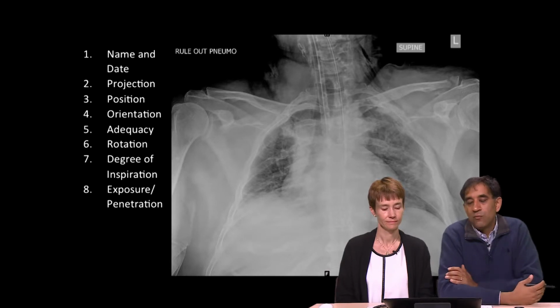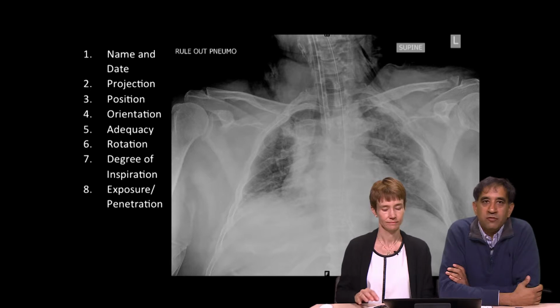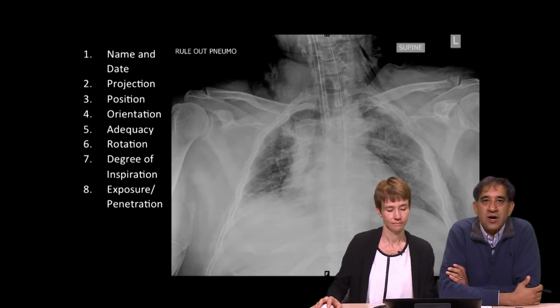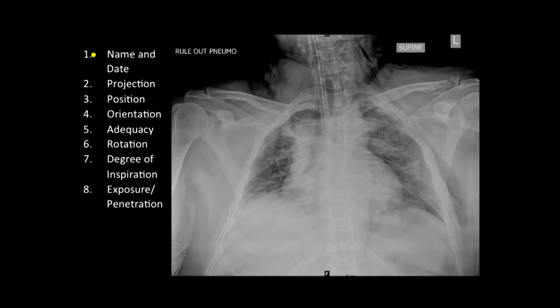And now I'd like Dr. Stevens to kind of put this all together. So we've listed these elements here, and we're going to evaluate each of these on this particular X-ray. So name and date we've had to crop off for privacy issues.